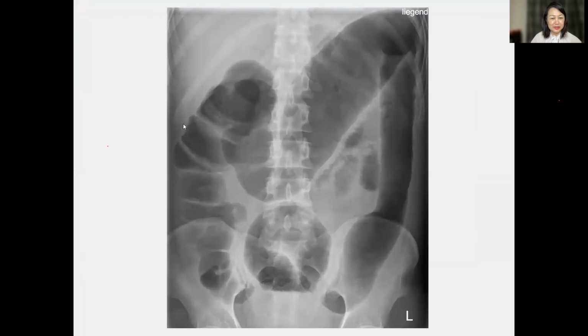Guys, what's the diagnosis? Everybody's slipping off already. Okay, large bowel obstruction. Yogesh, yeah. Is Yogesh a radiology medical officer? Seems to know a lot.